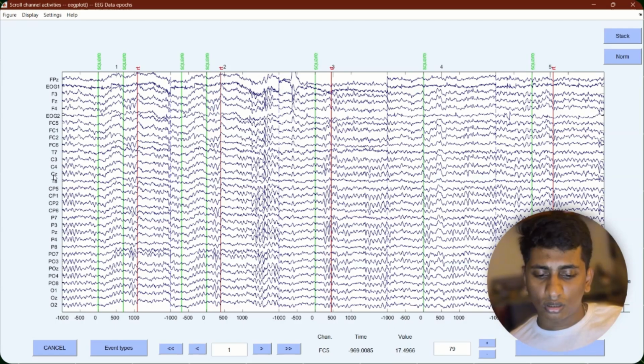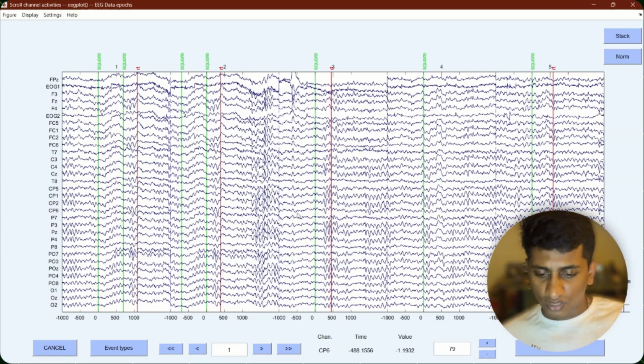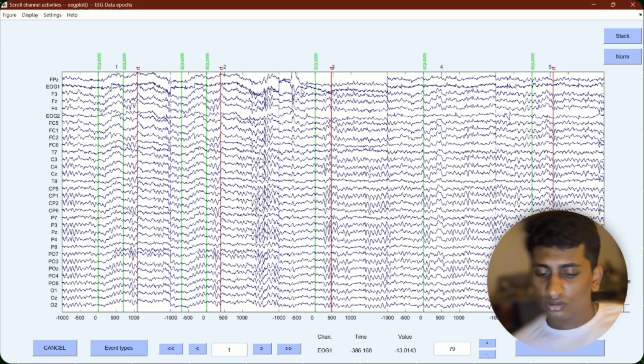These are the important demo parameters, like plotting a window length of 10 seconds, vertical scaling of plus or minus some microvolts for clarity. We can see the blinks as large frontal deflections, and high frequency spikes from muscle artifacts. Decisions.